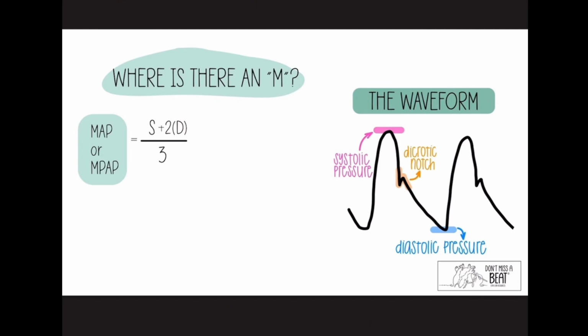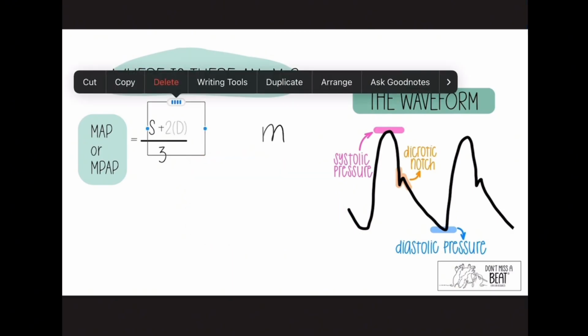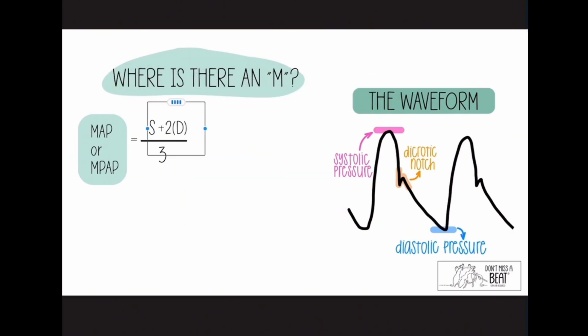Now remember, the other one was during the atrial pressures, right? AV mean. So you need to know these means are not the same. When I'm writing my pressures, my little cheat sheet, I write AVM for this one, but whenever I write my PA pressures, I usually write systole, diastole, MPAP for the PA, and systole, diastole, MAP, so that I remember these are different from the atrial mean with the AV and mean.